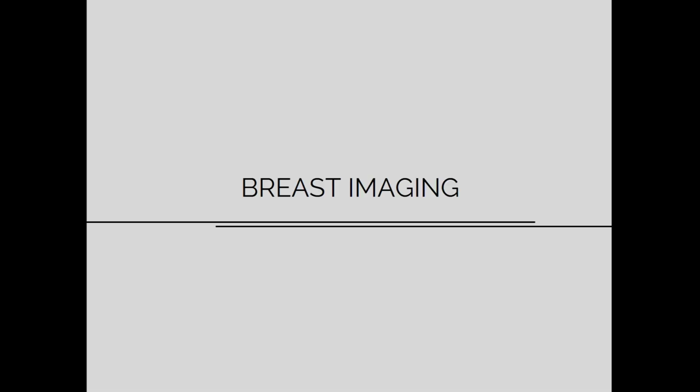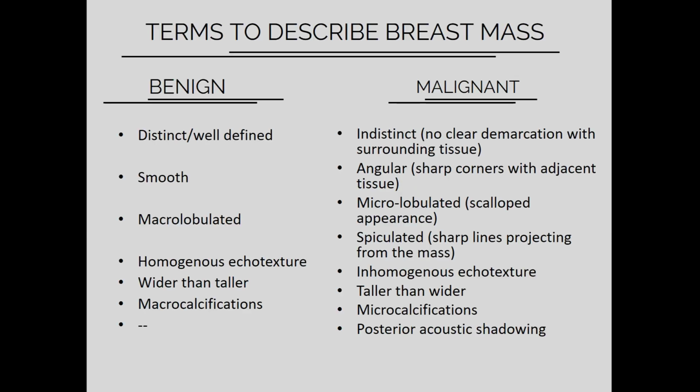Now we will be talking about breast imaging, and these are specific terms that will be very helpful to describe any breast mass. Please remember these terms while describing, because with every slide I'm not describing accurately. Naturally, I'm just focusing on the very important finding, but when you have to write in your exam, you have to write the findings in detail, so you can use this terminology.